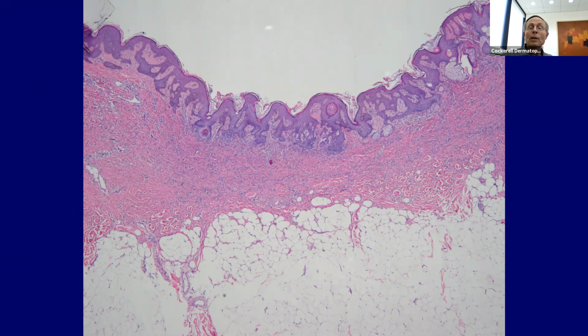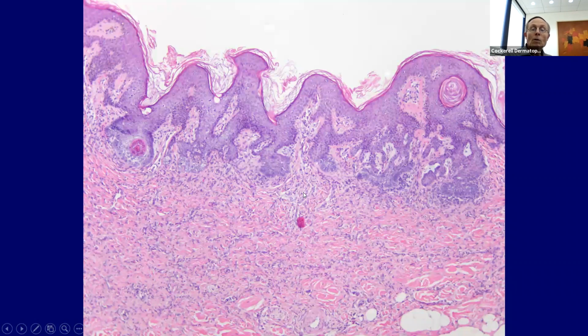Okay, here we've got a pretty large excisional biopsy. Pretty easy also, so hopefully this wasn't much of a challenge to you. You can't see the size of it, but it's pretty big, and it was an excision. And overall, it was relatively symmetrical, well circumscribed given the relatively large size of the lesion. But it's another spindle cell proliferation, but it's also got an epithelial component to it. So here we see the cells are more angulated and jagged in shape. There's some dilated blood vessels. There's some inflammation. We've got this basaloid proliferation at the dermoepidermal junction.